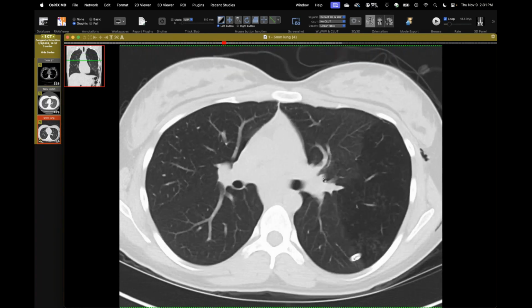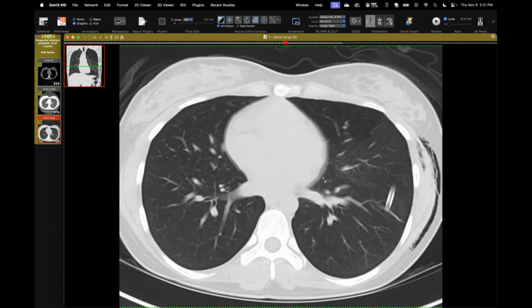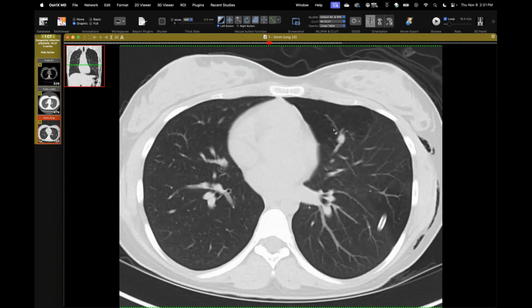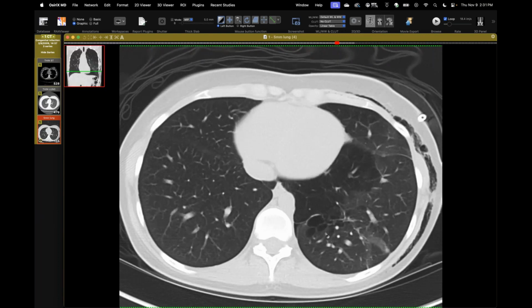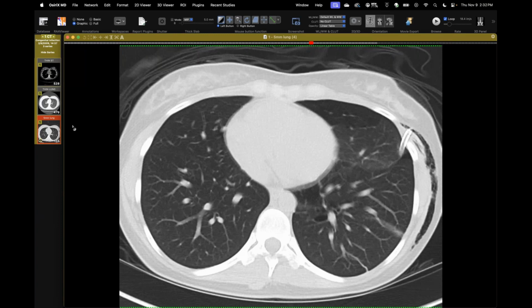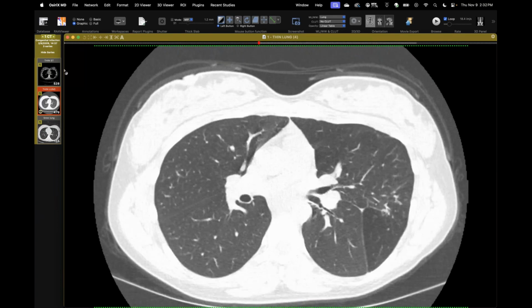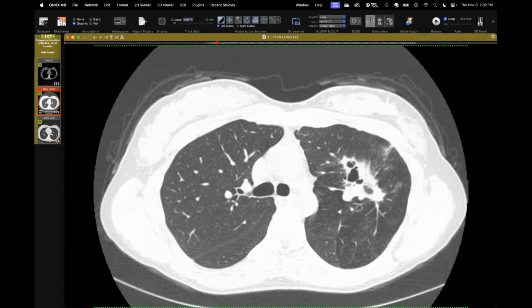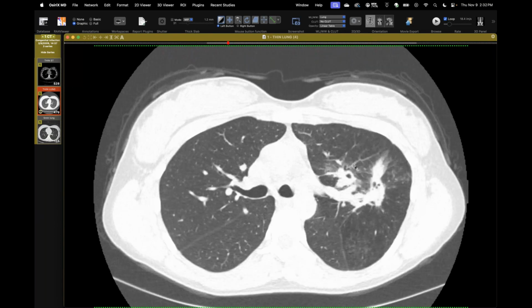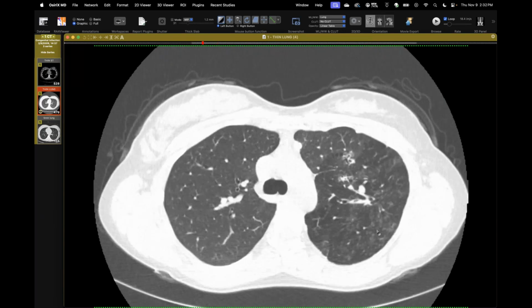So this is a patient who has bronchial atresia, and it's interesting because it's in multiple segments. And then I suspect this is a little CPAM down here. So a congenital lesion. But what happened is this patient then developed an infection in there, and so they developed this consolidation and cavitation around these airways, and you can see a bunch of small inflammatory nodules around it.